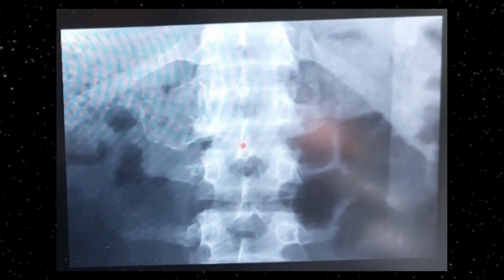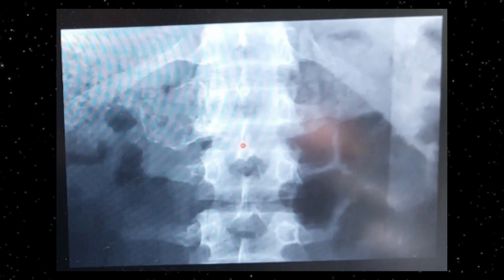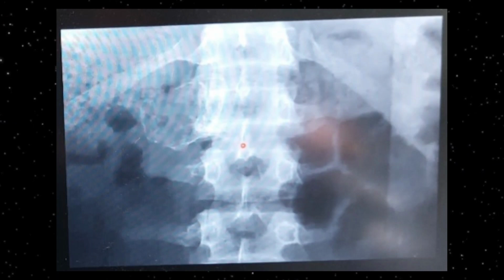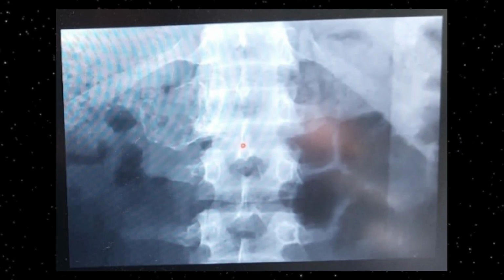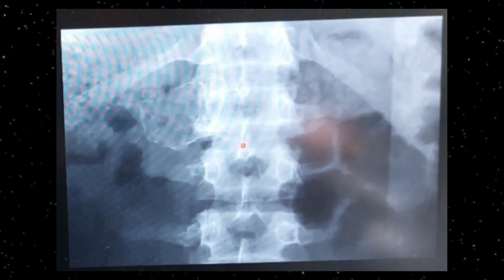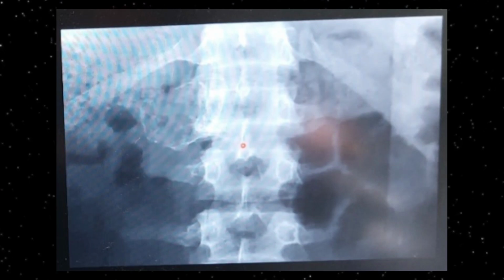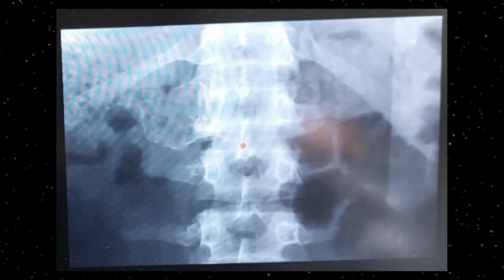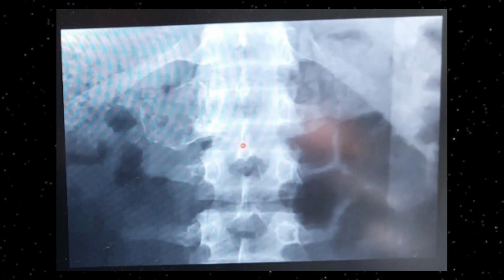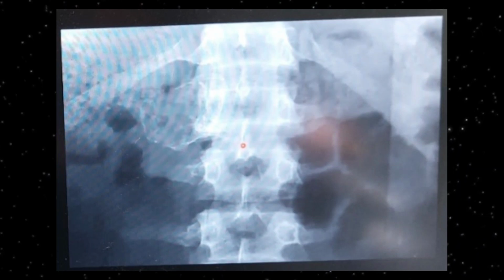Here on this X-ray of the lumbosacral spine, you can appreciate that the left-sided transverse process has been expanded due to a well-defined lytic lesion. Although there is no cortical breach, on this particular X-ray you cannot appreciate mineralization, but in some cases there will be mineralization. So this is an example of osteoblastoma involving the left transverse process of the first lumbar vertebra, and it will appear on the conventional radiograph like that.